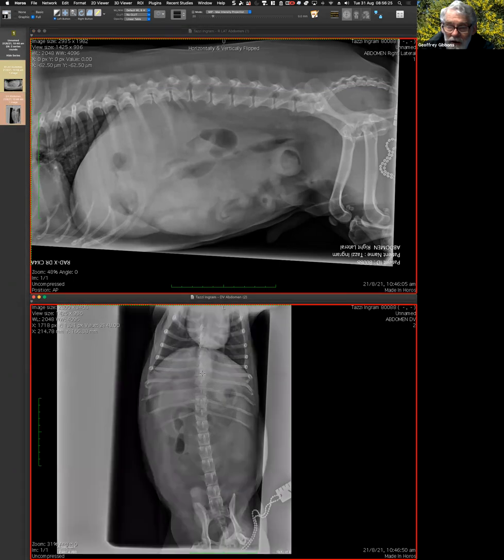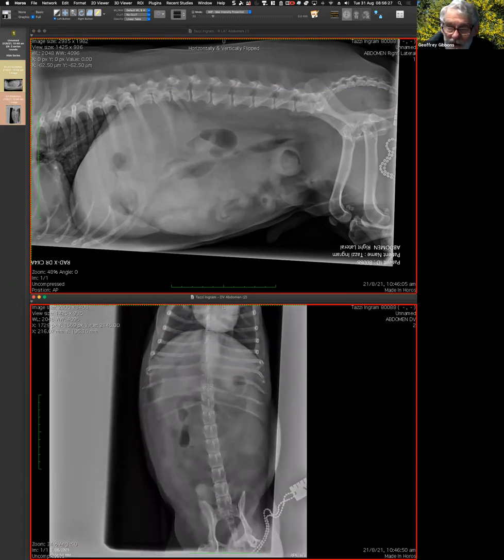Mariano, any questions about the case? Not on that case, but on that principle. In medicine, the idea is to find every abnormality and investigate it. And many times I've got the diagnosis, like you, by investigating something simple and peripheral. And that's why I asked about the bend in the tail, which could easily be just positioning. But while the dog's sedated for the x-ray, it's very easy to put a finger in and check it. Absolutely. And that's why I said I enjoy your points. You are bringing that angle to the discussion.